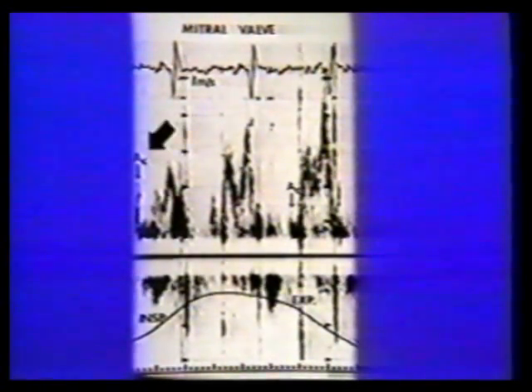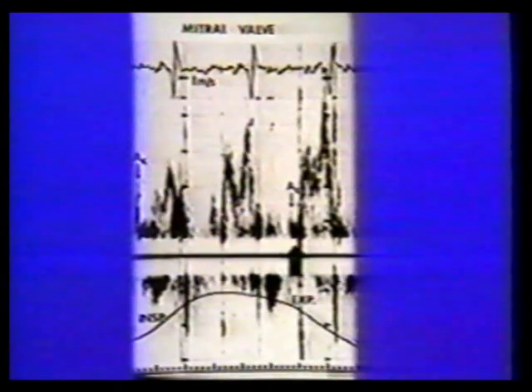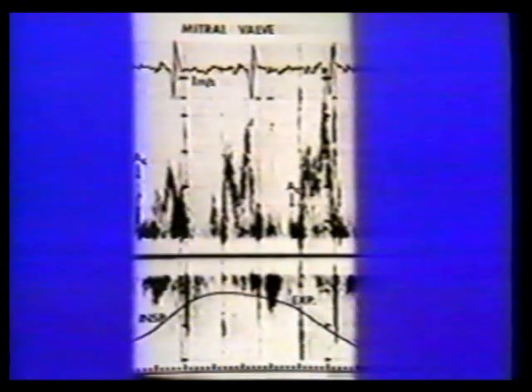The abbreviation AC stands for aortic closure. The isovolumic relaxation time for patients with tamponade is lengthened with inspiration compared to expiration. The reduction in diastolic filling gradient with inspiration causes the mitral valve to open later, and this is what prolongs the IVRT.